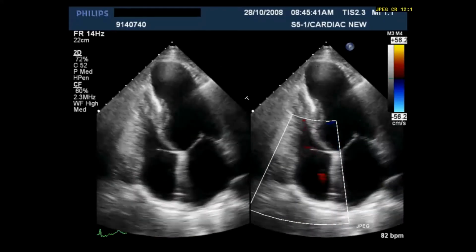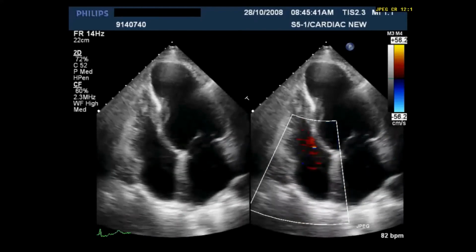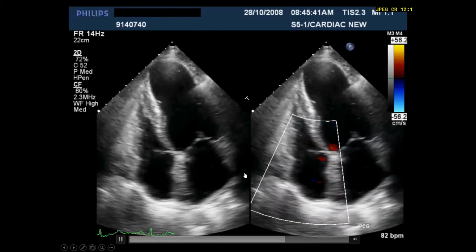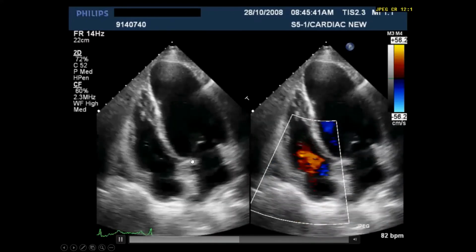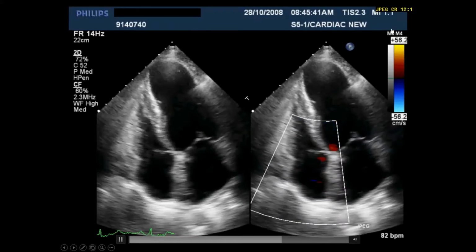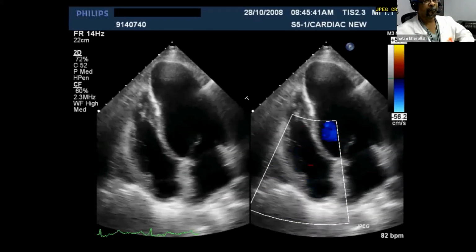Sorry, sir, the image is not clear. It is clear. Maybe I will... Okay. Is it better? It is clear. Okay. What do you see?